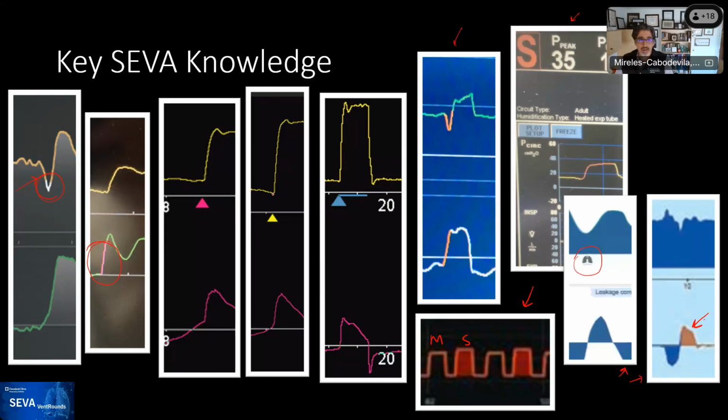And the same over here, it's very hard for me to see. So it has turned out that now, with the level of technology that we have and with the screens, the usual dictum that you would see a pressure dip in your pressure waveform is no longer true, and you have to rely on the ventilator telling you if it's a patient signal or not.